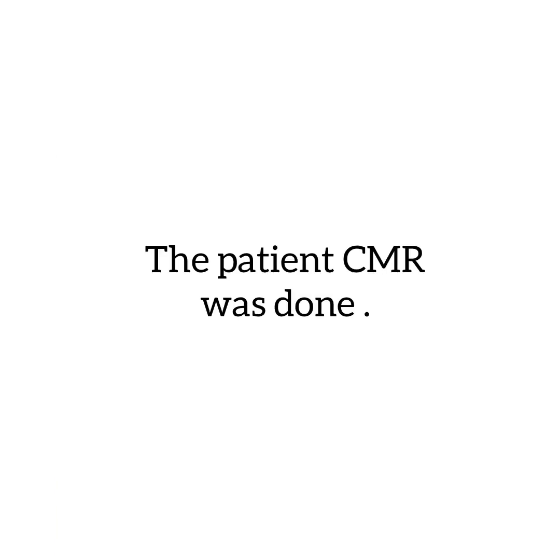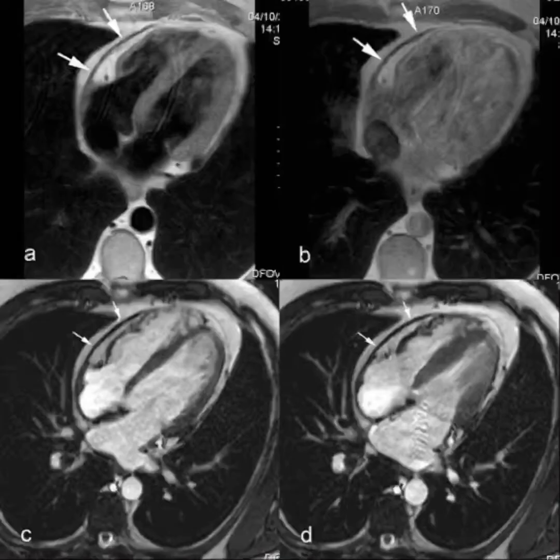So the patient's CMR was planned and was done. You can see the different findings. There is a thick pericardium around the heart.